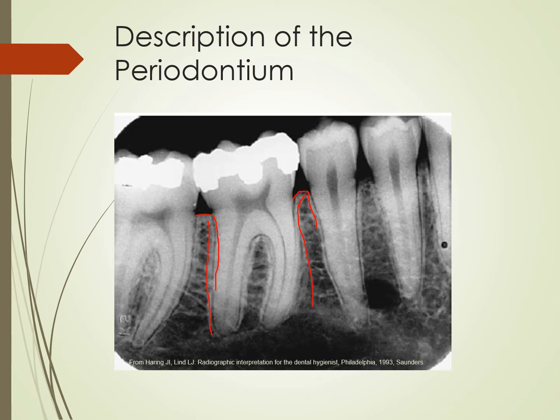That's a good thing. Now, we don't necessarily see, you can see the lamina dura really well here, and you can see it really well here, but you can't see it quite as well right there. Right? That is actually an indication of a little bit of fuzziness there. So this crestal bone over here is actually beautiful. So that alveolar crest there is beautiful. This alveolar crest, beautiful.